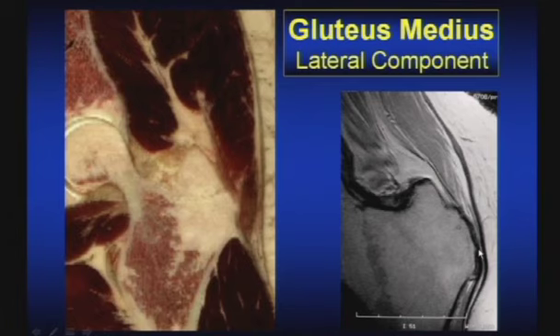When we talk about muscular attachment sites, really what we're saying is that there's no visually observable tendon component. As we look by MR or even specimen photograph, it looks like the muscle is attaching directly to the periosteum. The transition of muscle to tendon to Sharpey's fibers to bone occurs, but it's histologic or microscopic in what we call muscular attachment sites.